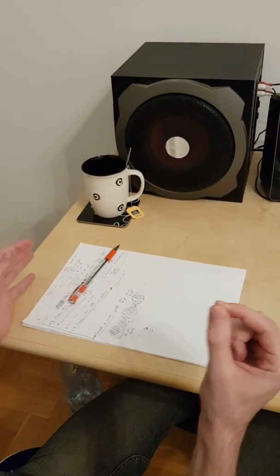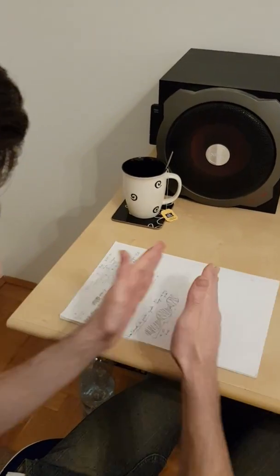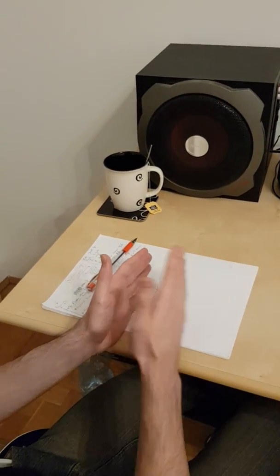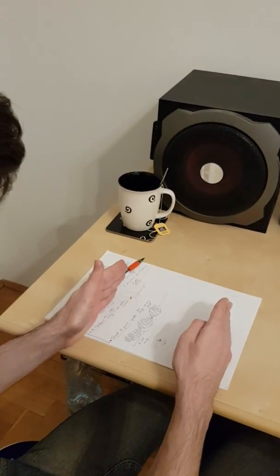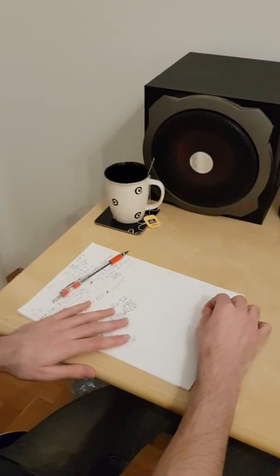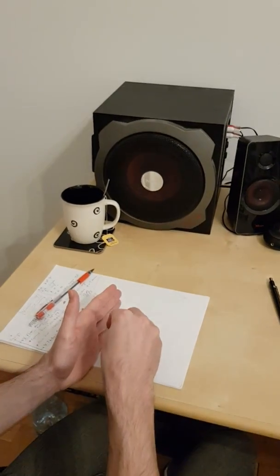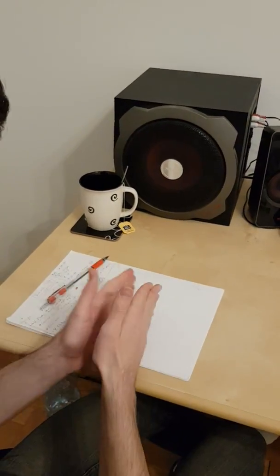Anyway, for this rate of 60 beats per minute, when every cycle gets a whole second, this third is appropriate. But what happens if this third is prolonged? Then the ventricles are working too much and not resting enough in every cycle, which makes them more prone to exhaustion. That's why if you see a prolonged QT, you really need to fix it. The other thing is, if it's too short, then it's not working enough, so it's not supplying normal depolarization for normal contraction. So both ways are problematic, a prolonged QT and a shortened QT.